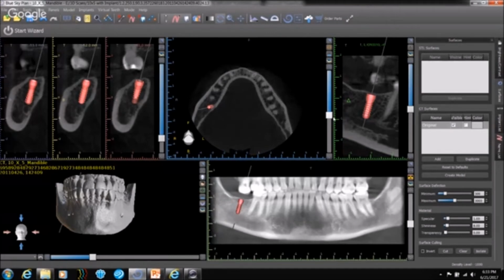You know, it might be a little bit too close right there. You can see it disappears though, although it doesn't perforate. Now, you might have a different way to do it. It is absolutely fine to pick the way for you to do it, but axial slices do have an important role.